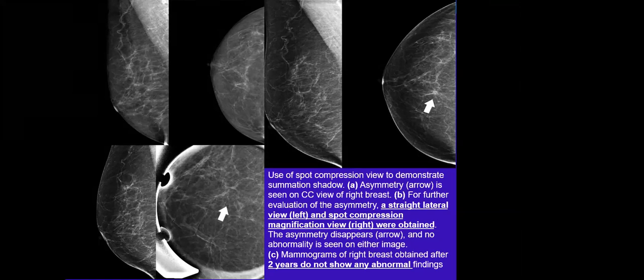In the previous lecture you started mentioning the arc: we should measure the distance between the lesion and the nipple, and then we draw this. Before that, we were talking about the lesion locations and the probability of them disappearing or appearing in the other view. What are the factors affecting the visibility, and the non-conspicuity of the lesions in the other view?